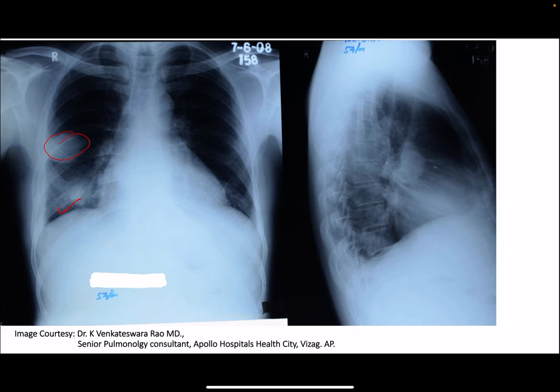phantom tumor. So in the lateral view you should always look for the tailing of this. Here you can see the tail, here also it's forming along the fissure. Okay, so these are findings you should carefully observe in any heart failure patient. And these are also evidence of LV dysfunction. Whenever there is a cardiomegaly, you should always suspect associated LV dysfunction and associated findings. Okay, so this is an interesting X-ray for today. Okay, thank you.